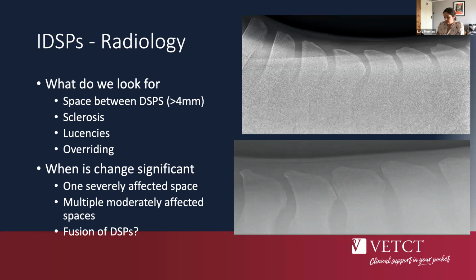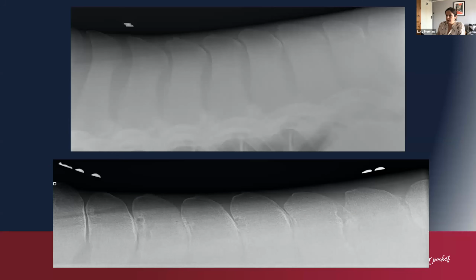Other ways that we can assess whether or not these are significant, well, we'll come on to scintigraphy in a moment and we'll discuss whether or not that will help us. So just some more examples of moderately affected backs.